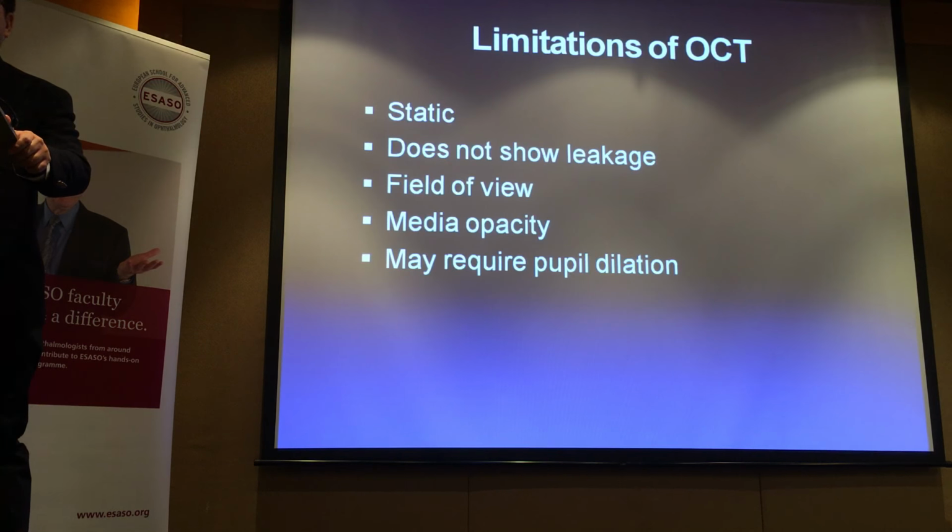So relatively poor vision. So he's got a guarded prognosis on that eye, but I performed cataract surgery on him because he had cataract with a PSC component as well, so posterior subcapsular cataract. So that was obstructing the OCT, so much so that I'm just getting a bit of static and gray pixels.